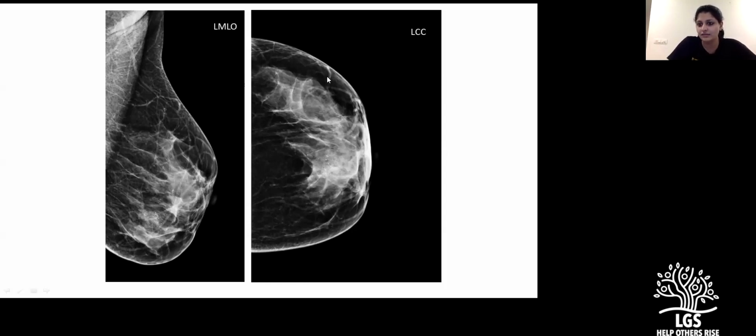But he says, this is Tabar's thinking, and actually, my personal experience, I have told the breast surgeons, please do not conserve the nipple because it's close enough. And then 2 or 3 years later, guess what? The DCIS has come back and it's involved the nipple. And not only that, sometimes these patients won't come back for their follow-up.